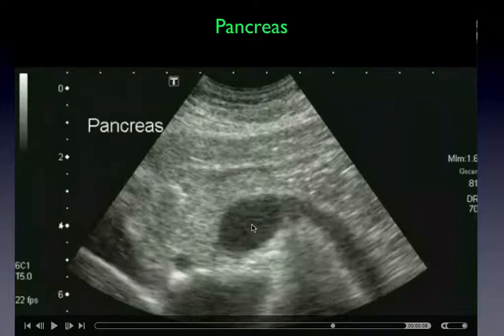and there was a question by the resident who did this about this structure over here, and they thought this was the duct of Wirsung, the pancreatic duct. And the answer is no, I don't think it is. Why? Because if you look at the margins of the pancreas, it seems to come across here, and then it comes down over here. So this is outside the plane of the pancreas. How is this duct going this way when the pancreas, we know, slides down this way?